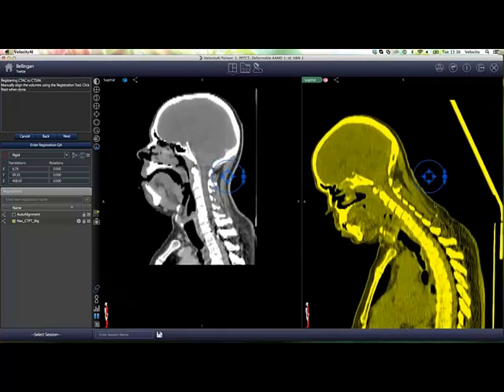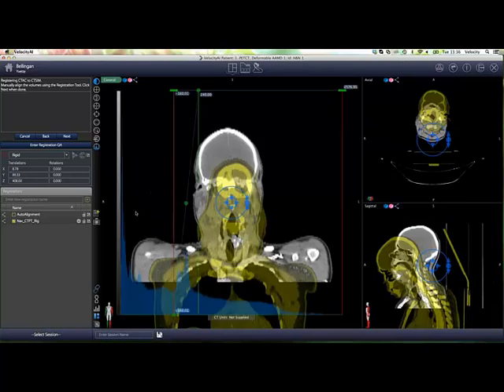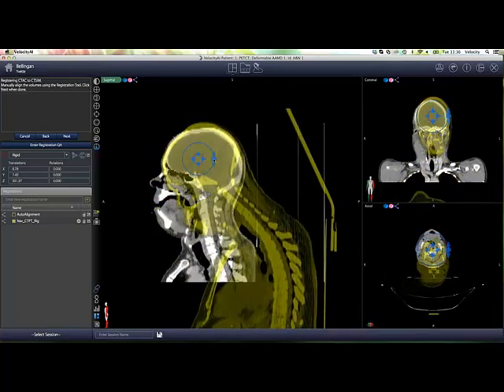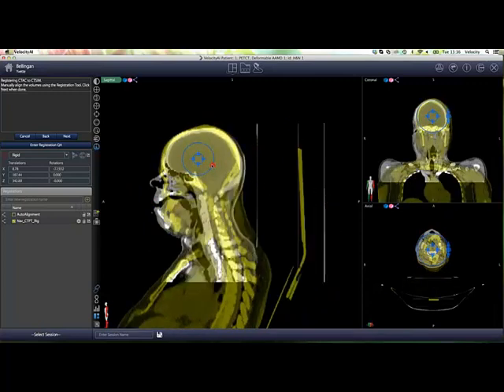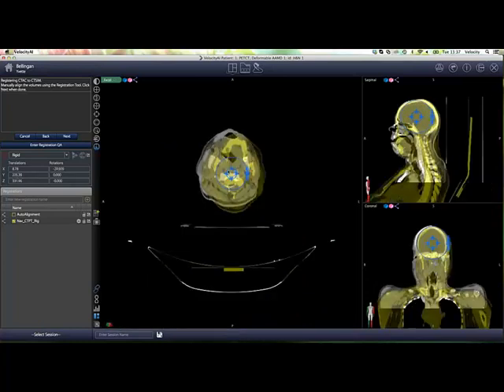Now if you look here, you can see we can kind of get this right, but if you look at my nose position here, you can see I've got a big discrepancy. There's a big difference in position. And if you also look at the mandible, you can see there's quite a big area of discrepancy. So once I'm happy with this alignment, I go on to the next step, which is the rigid. For the rigid, I don't really have to set a region of interest, but if I don't set it now, I know for sure I'm going to forget.